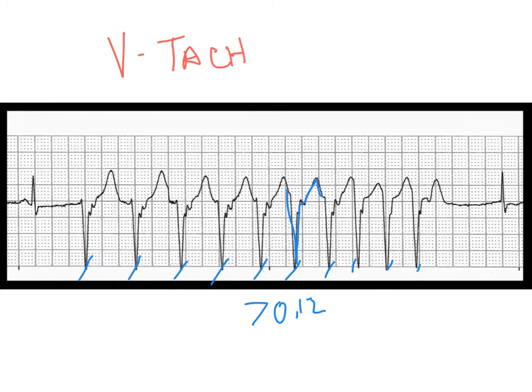It could be that they are getting this patient, he's running VTAC. They decided to get him to hold his breath, what we call vagal maneuvers. When that happened, he held his breath for a minute, it stopped it, and then he goes back into a regular rhythm. Could be a lot of different things going on here. I don't like the way that's written. But greater than 0.12, the ventricular nature, this is VTAC because they are over 100 all the way down. So we actually have a run of VTAC here, a run of VTAC.